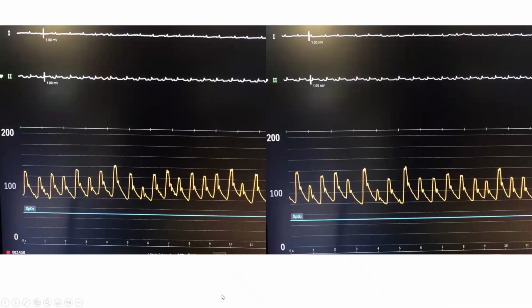This is another case. This is an aortic pressure waveform. What diagnosis does it suggest? This is a classic pulsus paradoxus. See how with respiration you get a near full collapse of the aortic pressure. This is not just mild respiratory variation in pressure. This is a full collapse of the stroke volume. Look at this with respiration.